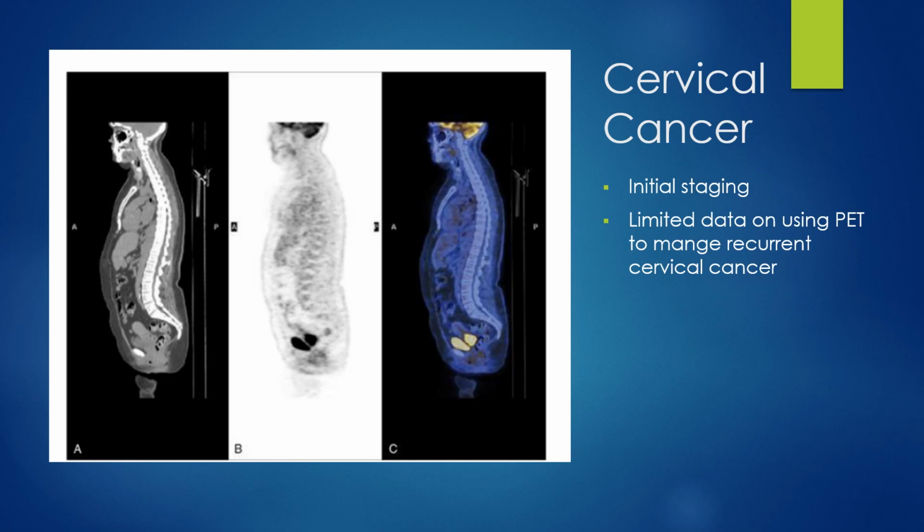This is very similar to prostate in that the anatomy is so close to the bladder that it makes it hard to detect on FDG images. And this would also be another case where it may be useful for the patient to have a bladder catheter, a urinary catheter, in place to clear that activity out of the bladder.